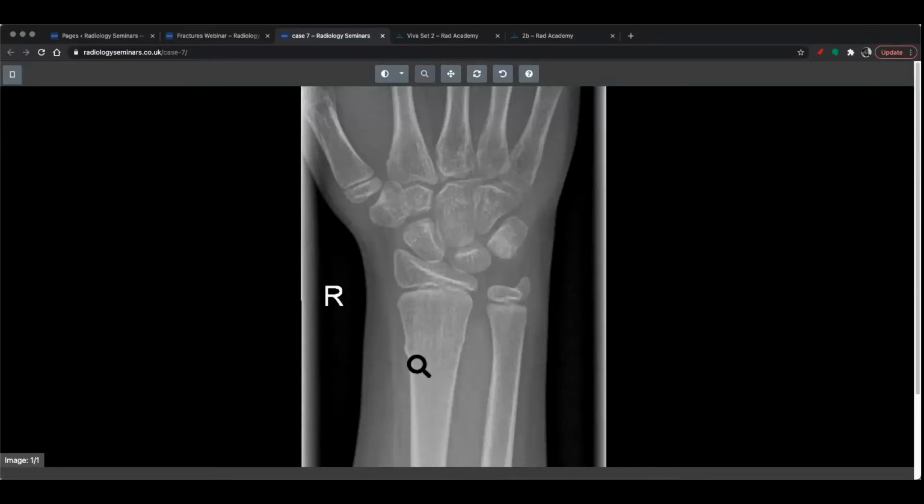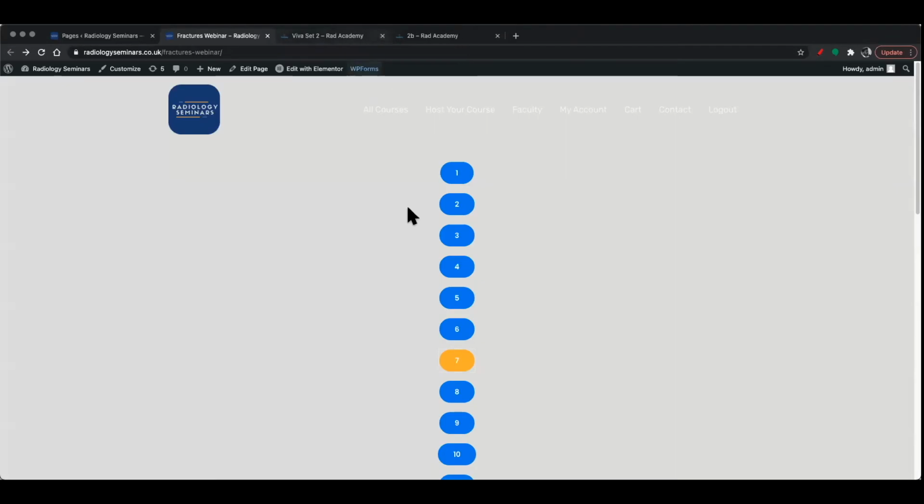And so what you're looking for is actually a bump. A lot of the time, you're not looking for a fracture line per se, you're looking for a bump, and that would be sort of a buckling injury. So this patient's got a sort of buckling injury of their distal radius, and this would be consistent with a greenstick fracture. So remember, pediatric patients, yes, I did show you a pediatric patient with a proper fracture, but they can also have bendy fractures. Young patients can have really bendy looking bones and therefore have bendy fractures. So that's called a greenstick fracture.